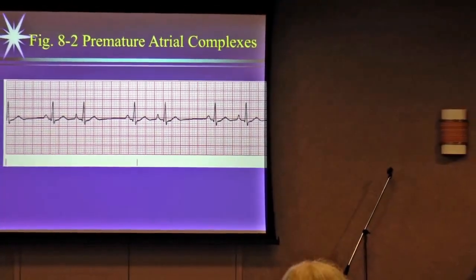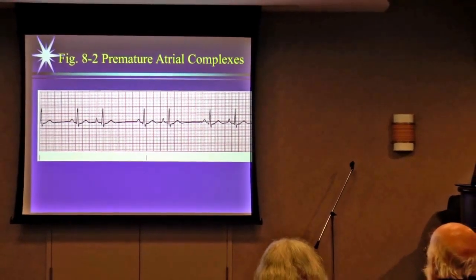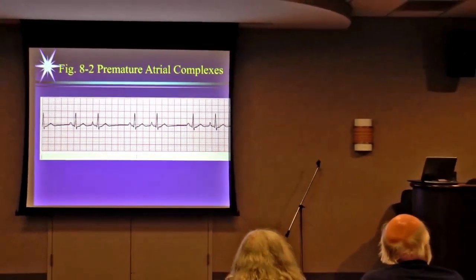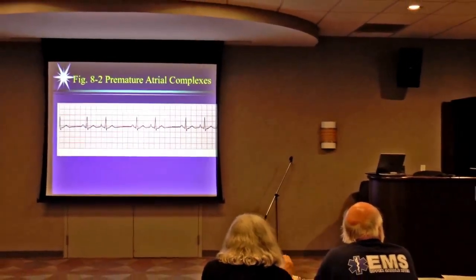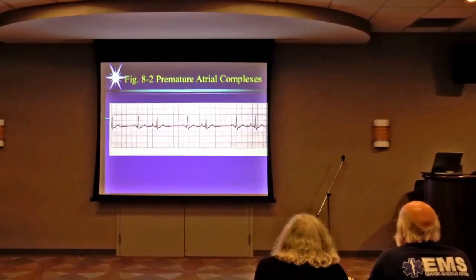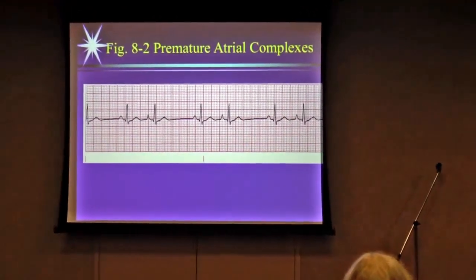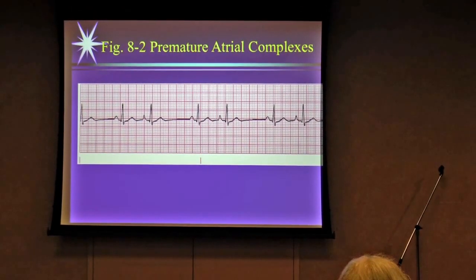So this is showing you that something a little more is going on than just once in a while. So this patient probably does feel it. Now, if these were non-compensatory, not generating a pulse, what would this patient's heart rate be? 1, 2, 3, 4, 40? Yeah. So they feel weak and dizzy.